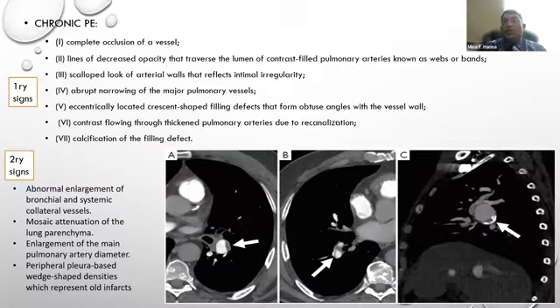It is not common to see infarction with the cases of the pulmonary embolism. Number two, infarction is usually peripheral and wedge shape. But if there is infection, and it can happen, it can concomitantly happen, like a patient with COVID. They have infection and they have PE.